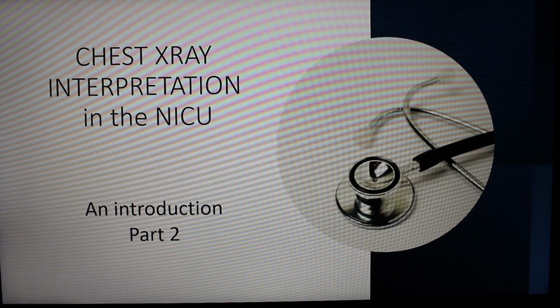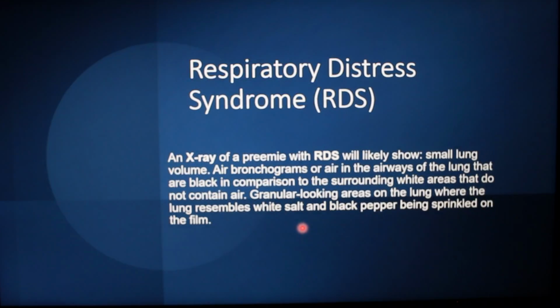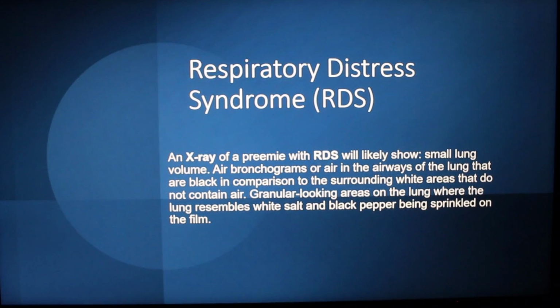So now we're ready to look at chest X-ray interpretation, part 2, where we're going to be looking at pathologic conditions we see in the NICU. One of the most common things we see is respiratory distress syndrome.